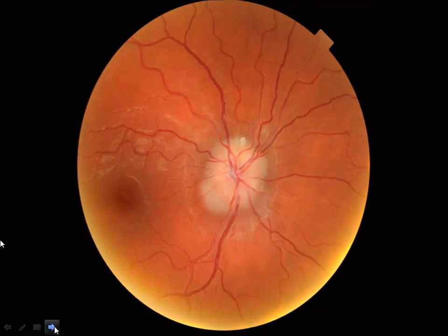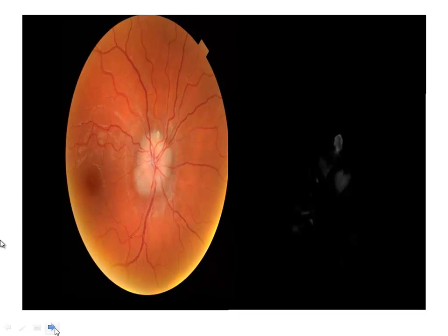Here's a patient with a blurred disc border. Again, we would get concerned about this, possibly think of papilledema, papillitis, or something like that. This one happens to be bilateral, except that this patient has a clear, obvious drusen, so there's a disc drusen. This gave me the opportunity of finally learning what disc drusen do to OCT, or how OCT interprets these. So here we have that disc drusen.